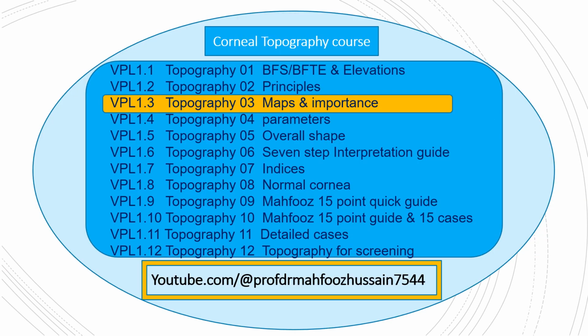In this lecture, we'll talk about the maps and their importance in topography.